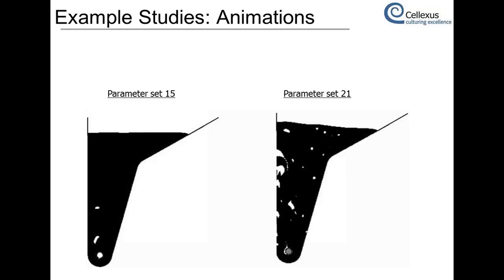In this case, we looked at the number of flow ports, flow rates, the gas mixture. You could change the ratios of oxygen to carbon dioxide to nitrogen, which changed the flow characteristics. We also looked at the head or the fluid height in the chamber or the cell culture height, and some other geometric parameters as illustrated in the schematic in the right bottom corner.